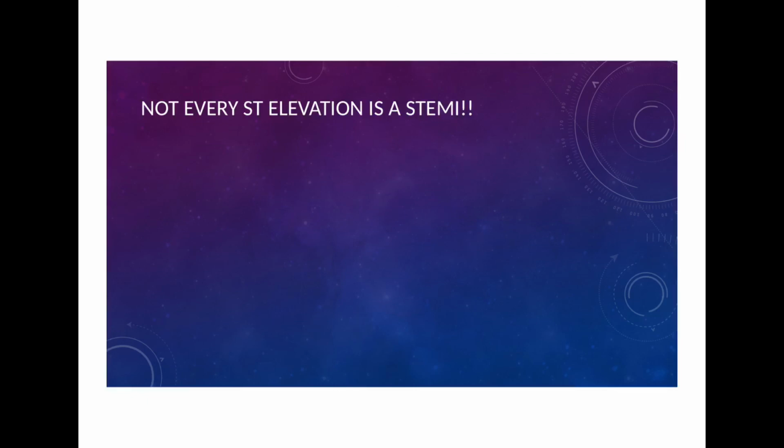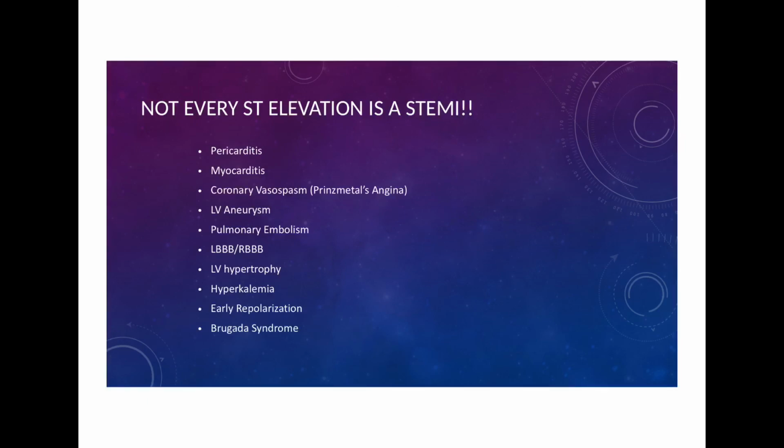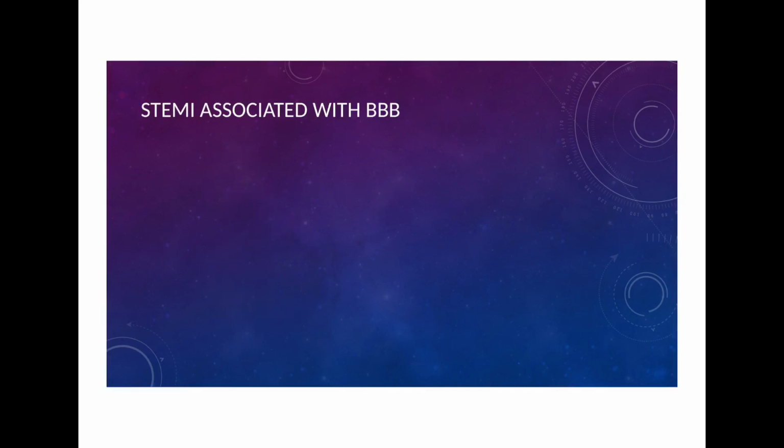Now, it's important to keep in mind that not every ST elevation necessarily corresponds to acute coronary occlusion. In addition to coronary blockages, ST elevations can also be caused by any number of these conditions, and it's important to look at the patient in context to see whether the ST elevation that you're seeing might be due to one of these things rather than a myocardial infarction.